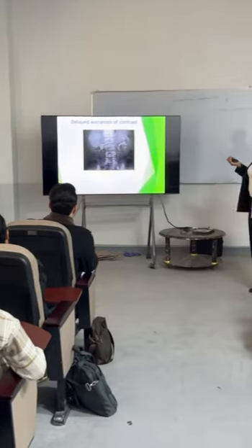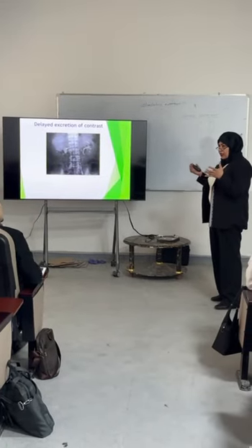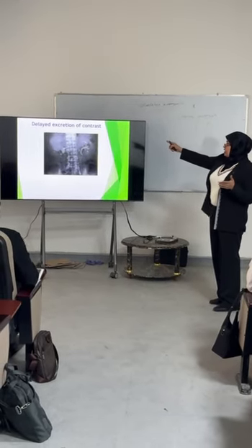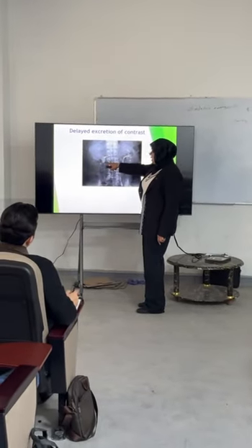Delay. This is a dense nephrogram. The wider, dense right kidney is regarded as a dense nephrogram, suggestive of delayed excretion of contrast due to obstruction in the upper part of the right ureter.